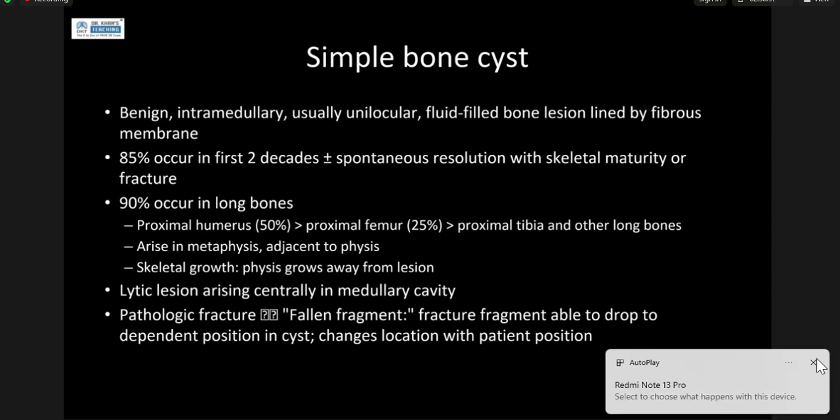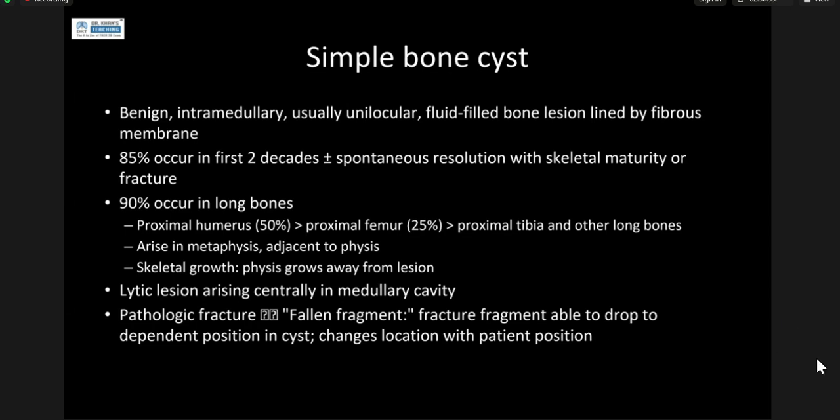As the child grows, they tend to move away from the physis. So you can see there's a fairly long lesion. And someone has also mentioned in the chat, you get that pathognomonic fallen fragment sign when they do have a pathological fracture through the lesion.